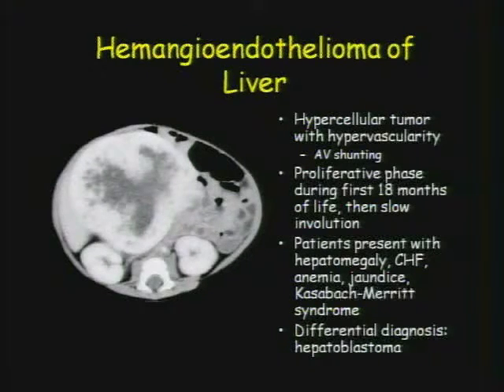The main differential is hepatoblastoma. The thing that you can try to use to help you is, number one, do you see shunting?